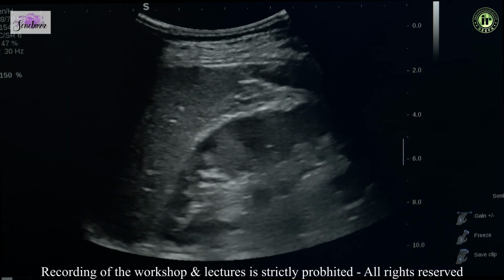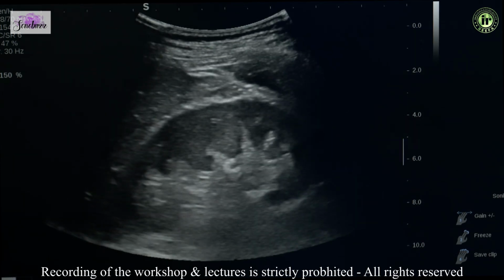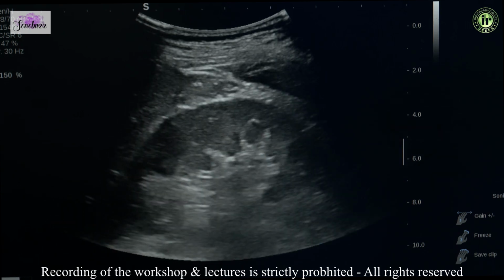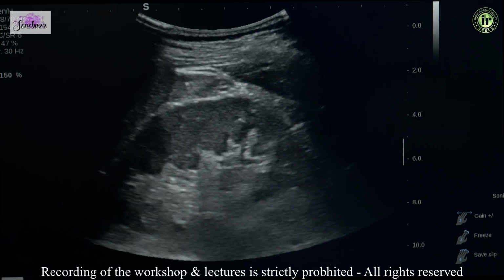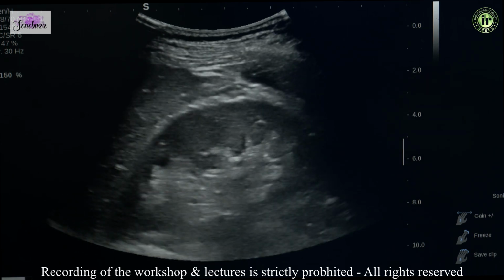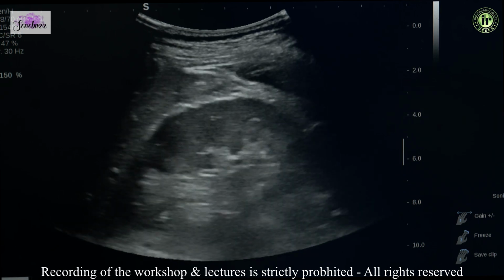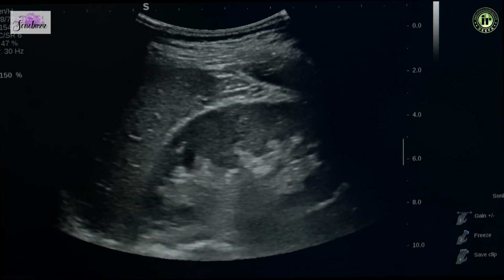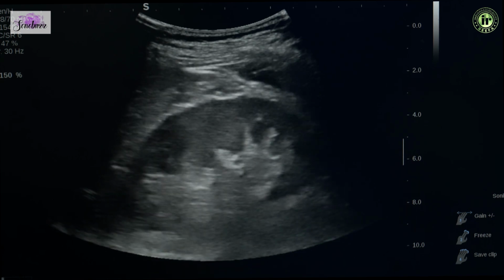The other very frequently asked question is, how do we interpret fatty livers on elastography? What I want to tell you is, whatever I have shown you up till now is only to assess fibrosis. We are not assessing fatty livers or the quantification of fatty livers on that. Well, but there is a new technology coming up. Hopefully in a couple of years this should be very well published, and we'll be able to even grade our fatty livers. But these are some of the new systems.